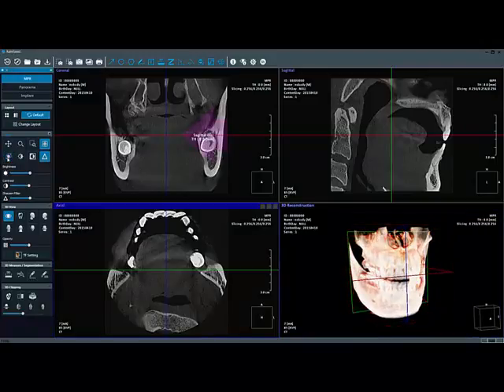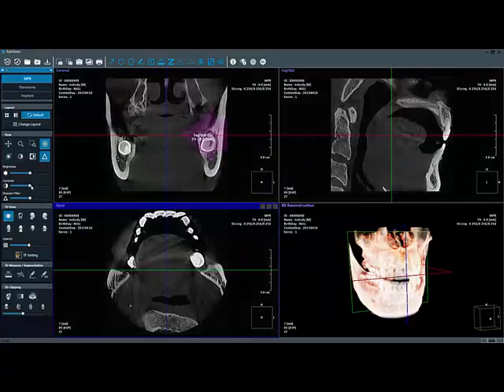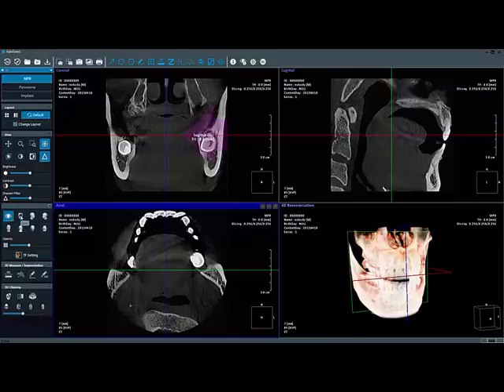You can adjust the brightness, invert the color of the 2D image, and apply the sharpen filter, which is one of our core functions of Rainforest. And you're able to modify the brightness, contrast, and sharpen filter with a slide bar. You can have the 3D image shown or not shown, and this function can be very useful to use with the ion.